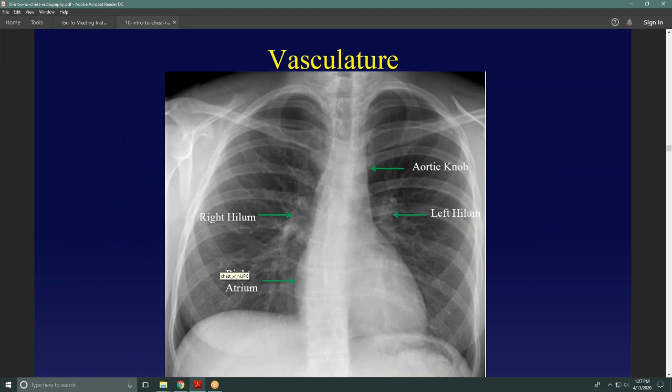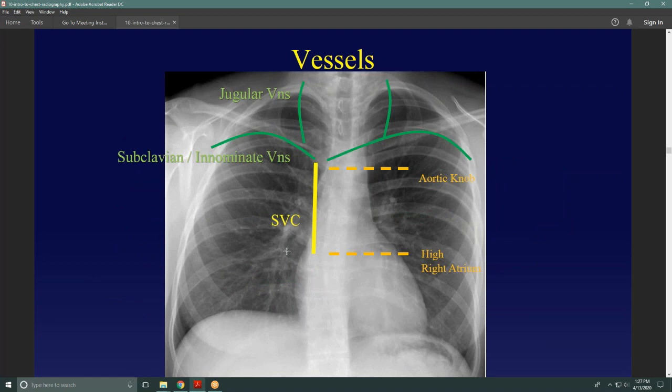So once again, we talked about the vasculature here, and these are basically where the larger vessels of the chest live. Your right atrium is going to be right here, and below that, your inferior vena cava. Insertion of central catheters through the lower extremities can happen, less commonly so. So we're going to focus on upper torso insertion of central venous catheters. They'll come in typically via the subclavian veins or your jugular veins.